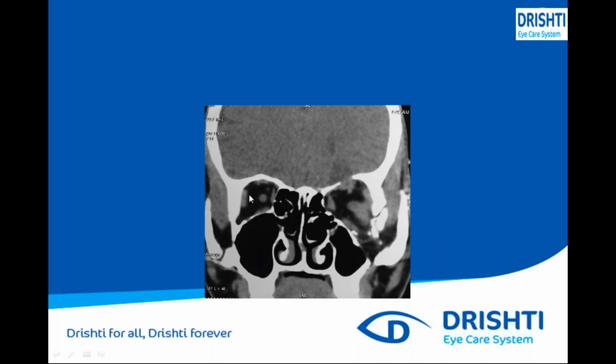If you compare the rectus muscles over here, this is the regular size of the rectus muscles. This can be measured. But here you can see, due to the fractures, these muscles are also swollen. Clinically, there should be pain while opening the mouth. There might be temporary swelling near your ear, on the temporal side, and the extraocular movement will also be restricted in this case. So always your report has to be matched with your clinical evaluation. This is the difference in how you need to see the reports of the patient.